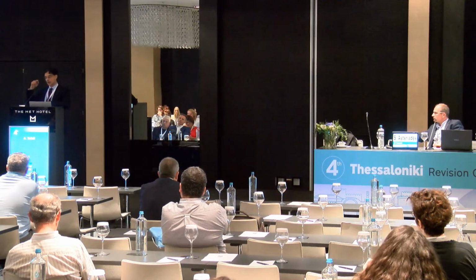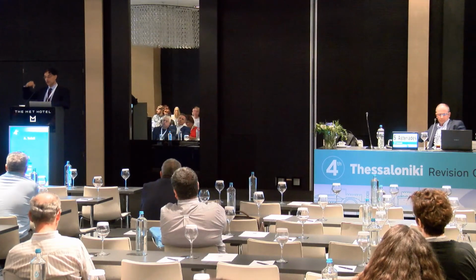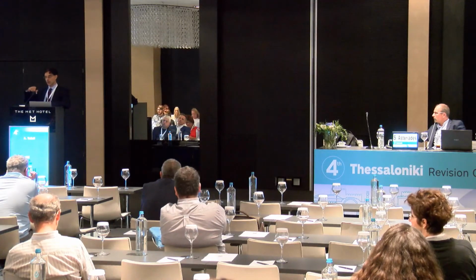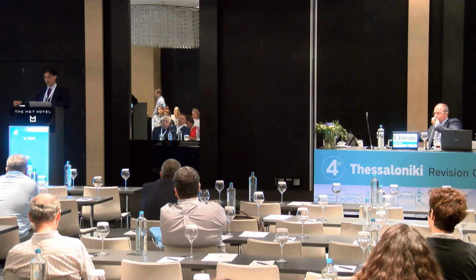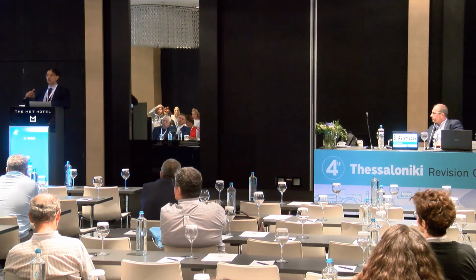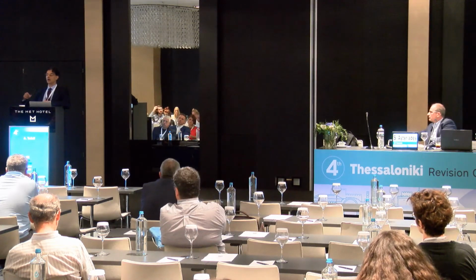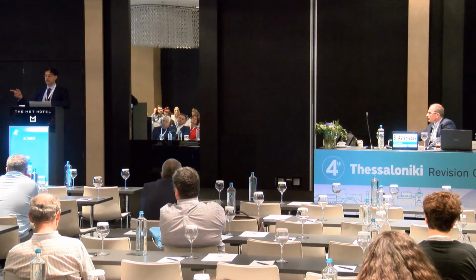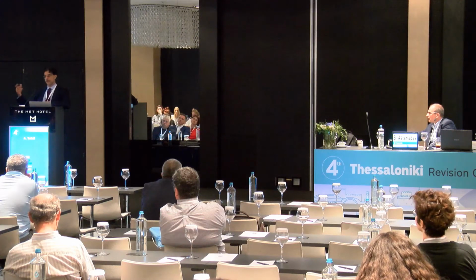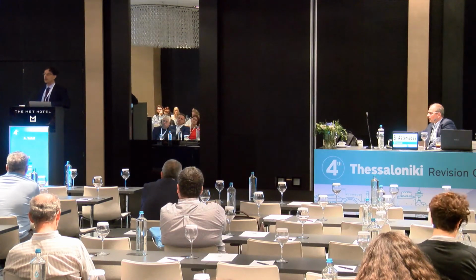So the trouble is we haven't got natural history studies where you have imaging showing an evolution of a type 1 network to a polypoidal network. And so it's unclear if one evolves to another. Groups like Bailey Freund's group are very much into calling polypoidal aneurysmal type 1 CNV, i.e. they're the same thing or they're classified together.